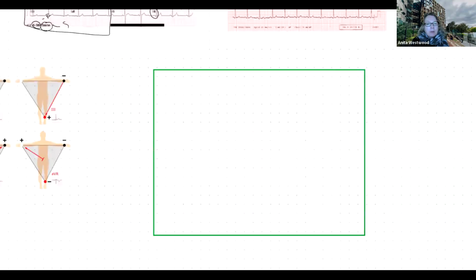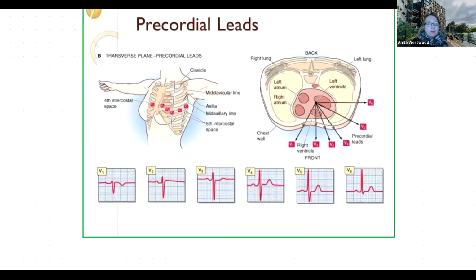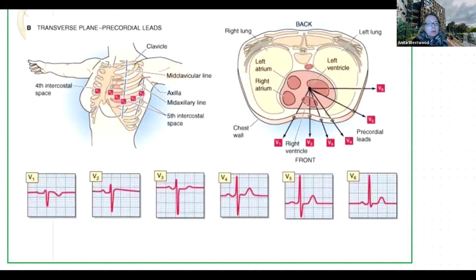Yeah, so that's a good picture. You can see there, looking at where it is. See V1 there on that right hand side, you've got that right ventricle. Remember, this is a horizontal plane, so these leads are going to look different to lead 2. But notice on the left side where that's placed on the chest, you can see V1 all the way around to V6 where we've placed it on the chest.